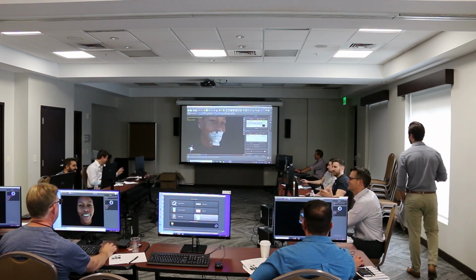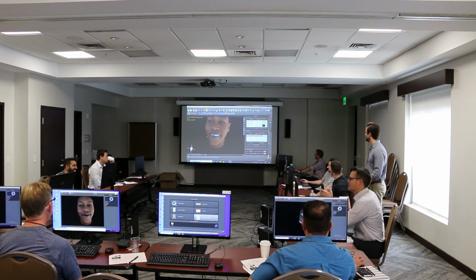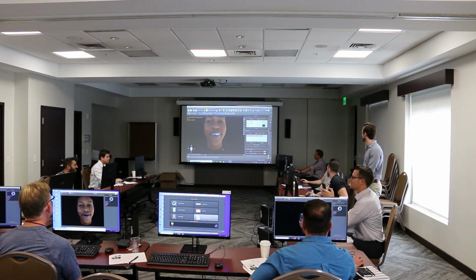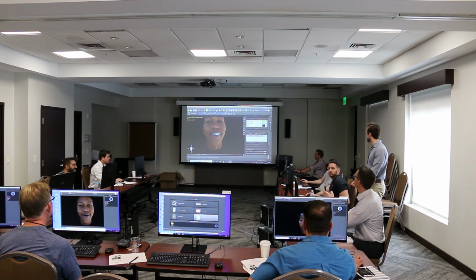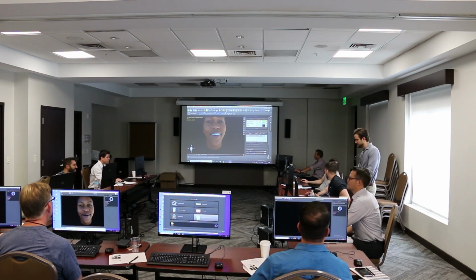So you don't end up with affordable dentures, this is what you should do. All right. So if you look here, you can see that it's not very accurate on stitching. We know, okay, that doesn't look quite right. It's close, but we can do better. And that's where the DICOM data can help us.